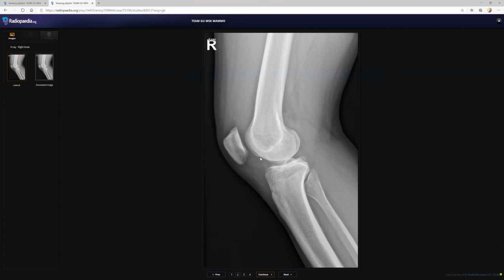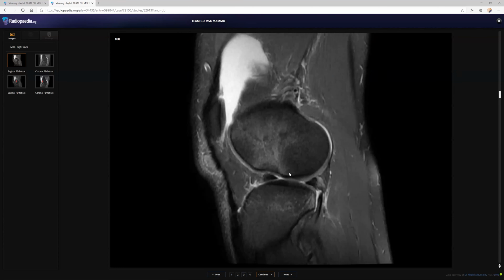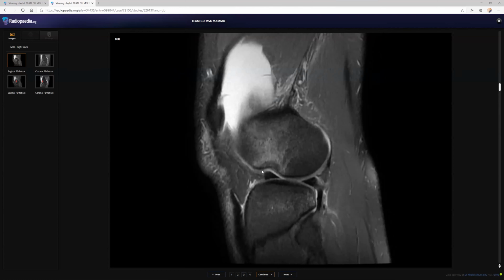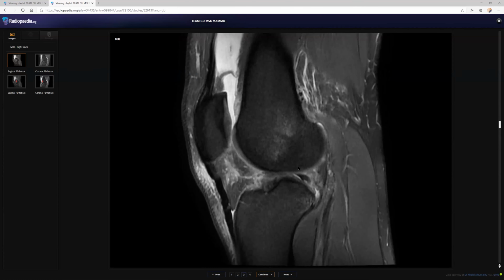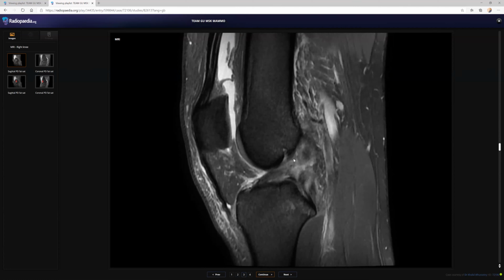This lateral femoral notch sign is usually seen in ACL injury. So you have to specifically say that you look at the ACL and you have to see the MRI, and you have to use buzzwords like the typical kissing type of contusion. And you have to say that your finding on the X-ray is confirmed in this MRI with the lateral femoral notch. Otherwise, your findings were good: there is complete disruption of the ACL, which is no more parallel to the Blumensaat line, and there is continuous diffuse edema, so it's a complete rupture of the ACL.